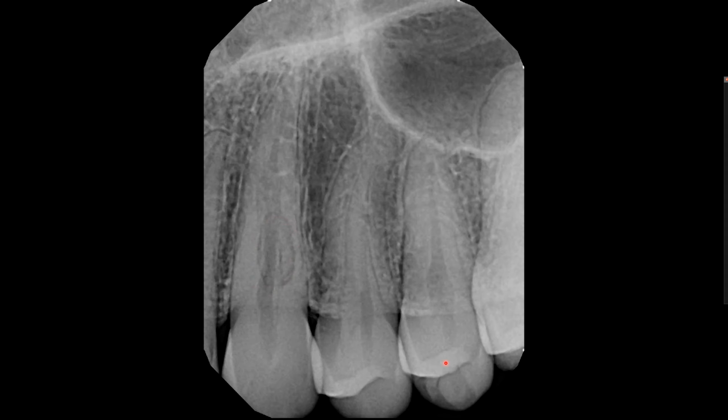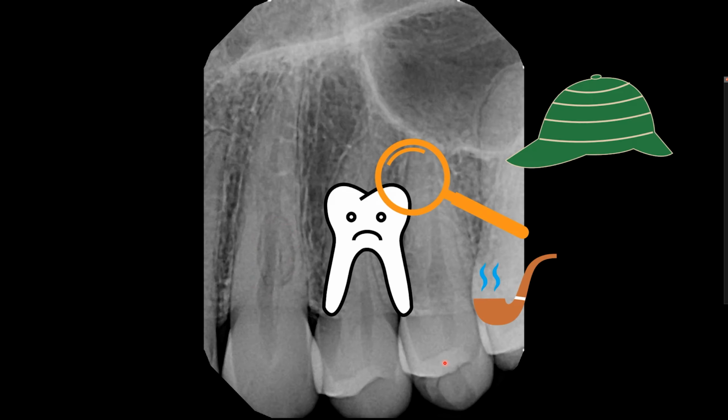So what is this? The fun of radiology is that you get to investigate what is hidden inside the soft tissues, inside the bone, and to figure out what is bothering this sad tooth and also figure out what may happen in the future. Someday, I think I should wear this hat and come to the class.